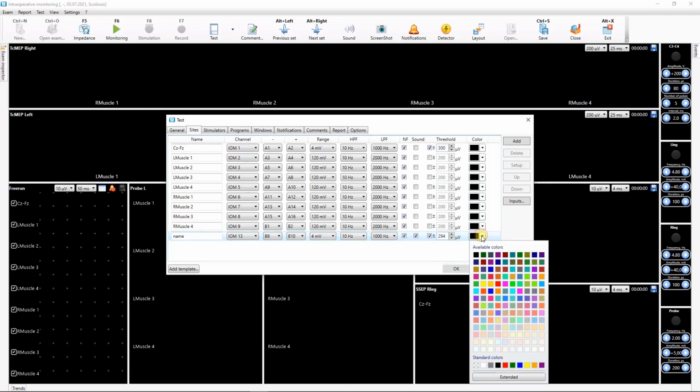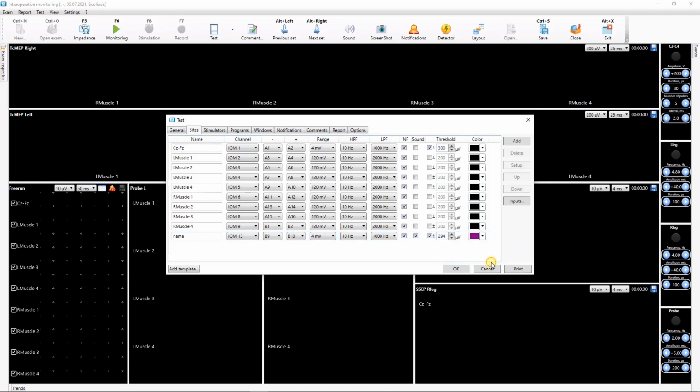In the last column, you can select the color of the site on the screen. Please note that the default color is black. Here, the actual site color depends on the color scheme settings, but we shall talk about it next time.